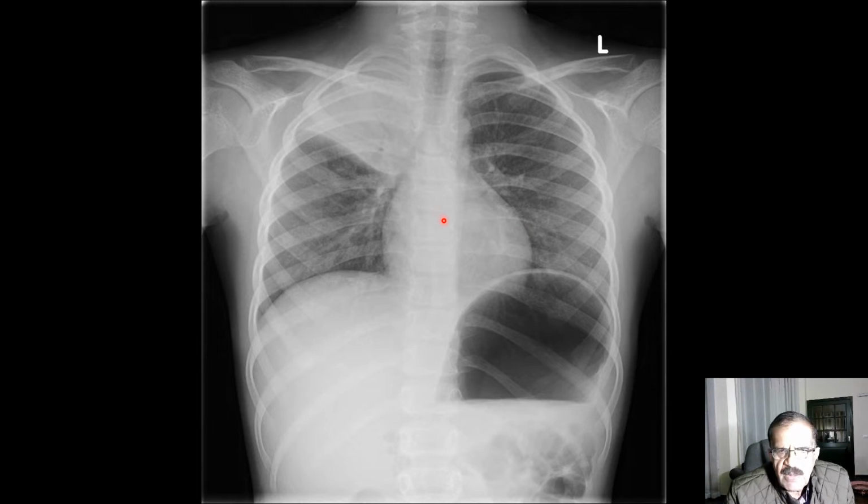Another X-ray, same abnormality, but in this case it is more dense. This is more uniform, affecting the entire upper lobe, and you see the transverse fissure. The lower border is again sharp, but it is not straight. Perhaps it has been pulled by this consolidation.